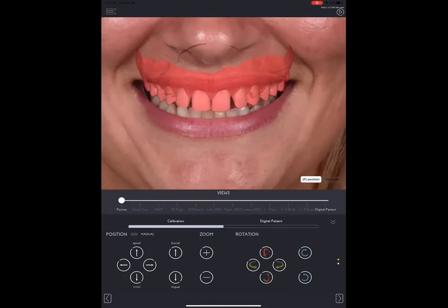But if you tap on these 3 points and hit set points, most likely you will get the files calibrated like that. A lot of doctors tend to ask me, oh, but what happened to the retracted pictures? Why are you not using the retracted picture anymore?